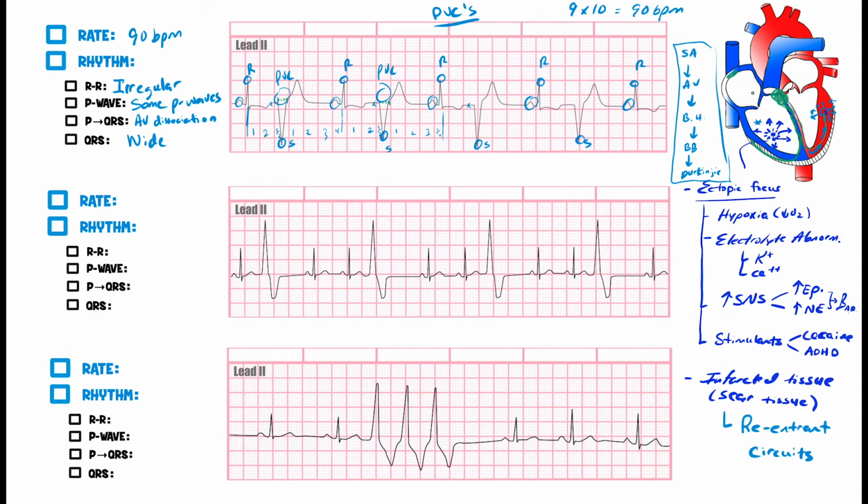All right, so before I move on to this next EKG, remember I told you guys that this is weird, that these QRS waves are actually going to be negative in deflection. Go back to the basics. Remember, this is lead 2. Negative electrode here, positive electrode here, right? And then we create this axis of this lead. Remember, the mean QRS vector, you want it to point towards the positive electrode. Well, what if in this case, this ectopic focus is firing, and when it fires, it might be firing this way, from the left ventricle moving over into the right ventricle.